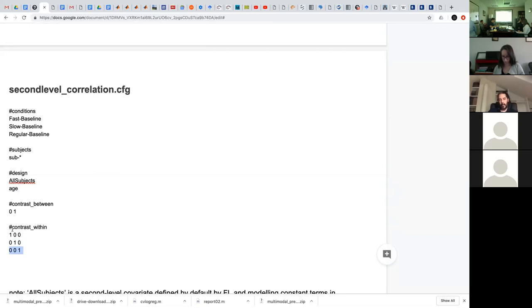So this is a way to do what some people call a conjunction, but it's not really a regular conjunction. In the SPM literature they call it a global null conjunction, I think. So they call it global null. It's a weird name. It's just like an OR question. Basically, you are asking the same question that you would ask by the individual contrast, only that you care about any of those things happening. In this case, is any of the conditions correlated with age. The resulting activation here just tells you overall. It doesn't tell you specific to any one of those conditions.